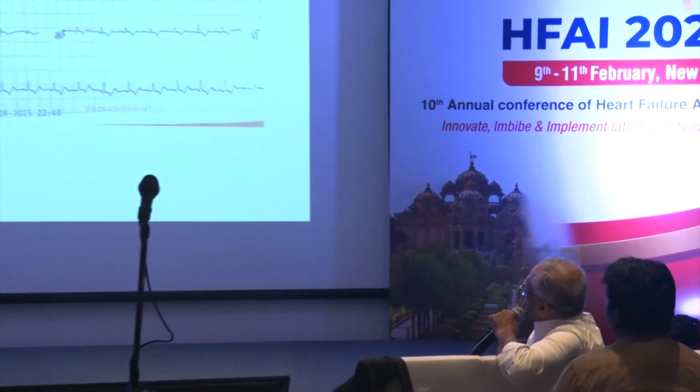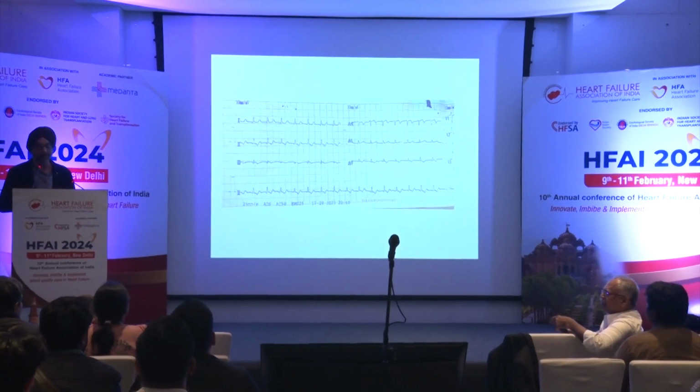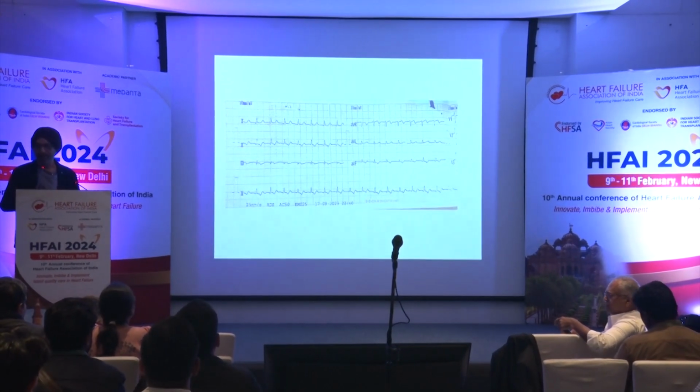So this is narrow QRS or wide QRS? Narrow QRS. Is it regular or irregular? Regular. And what is the relation of the P to the, where do you think is the P wave? So where do you think is the P wave is the most important question. After QRS? So this is the P wave? Good. So, it's so simple. Even if somebody had said it's a narrow QRS tachycardia, I think it's a supraventricular, I'm very happy. But you have to make an attempt.